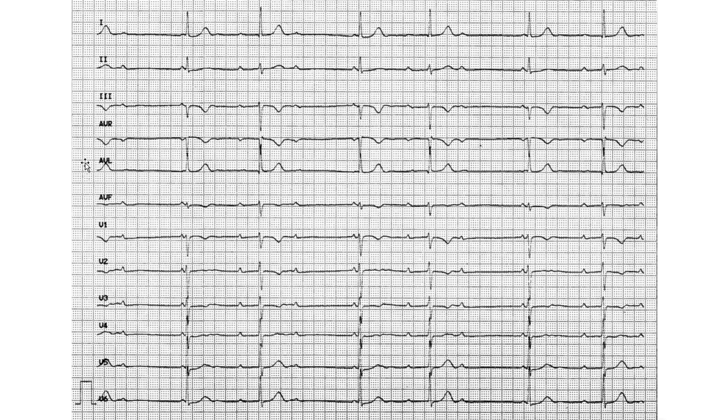So an example is over here. This is example 37. If you want to check it, you can definitely expect what kind of pathology it is going to have, because I just explained it. So is it regular or not? It is clearly irregular. Point 1. Point 2, P waves. I see P waves. It's a P wave, P wave, P wave, P wave, P wave. Clearly the P wave is sort of moving around. It's at different distances from the QRS complex. Here it's right next to it. Here it's quite far. Oh, lead 2 is better. P wave there.